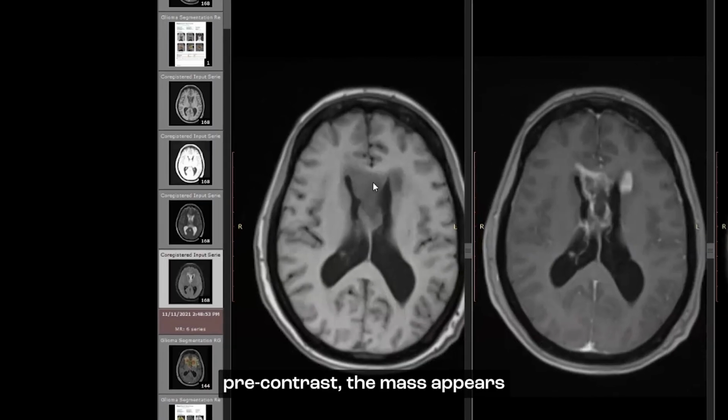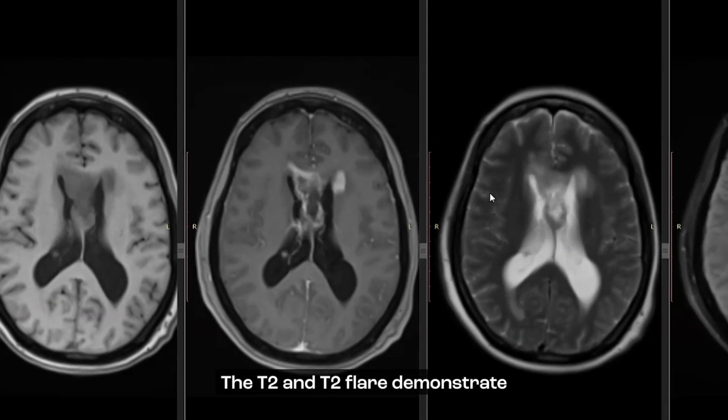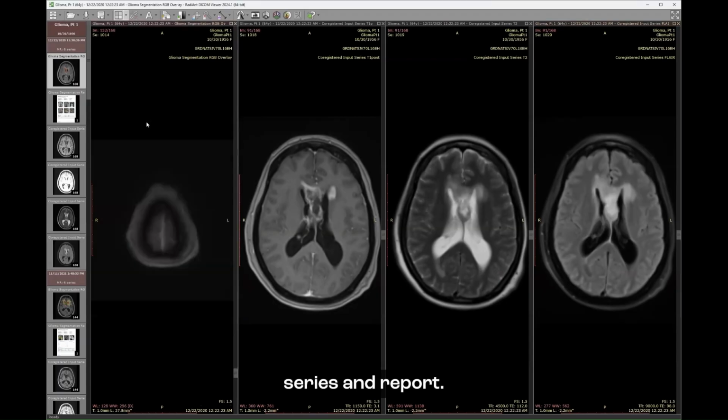On the T1 pre-contrast, the mass appears hypointense. On the T1 post-contrast, there's bright gadolinium enhancement, indicating active tumor. The T2 and T2 FLAIR demonstrate edema and FLAIR hyperintensity in the surrounding tissue. Now we'll review the corresponding segmentation series and report.